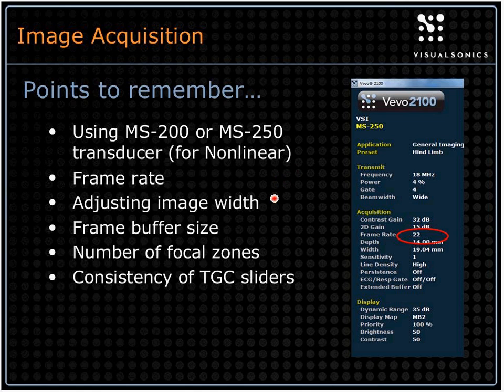Very key. Things like the image size, so the frame rate, the image width, and the frame buffer size, these to varying degrees together and apart will control the amount of data that you have. VevoCQ requests that you have a fairly long clip, 20 seconds or greater, which will give time in perfusion kinetics for the microbubbles that have been injected to come up to close to a constant or peak level of circulating bubble signal.